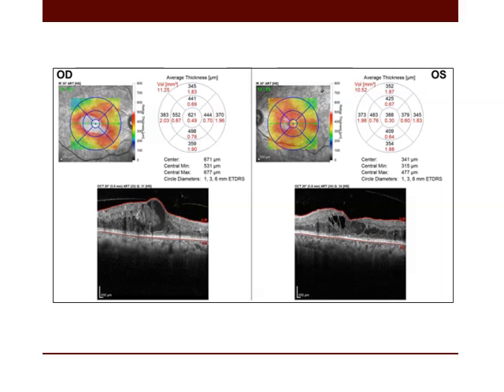Why is this scan important? Because it's very important in detecting macular thickening and also in follow-up of its therapy. If we see here, this is the central thickness, not the average foveal thickness. This is the central minimum, which is the minimum thickness in the central ring, and central maximum, which is the maximum thickness in the central ring. This scan consists of many B scans joined together to give you this information. However, it is a somewhat small scan, not covering the entire macula.